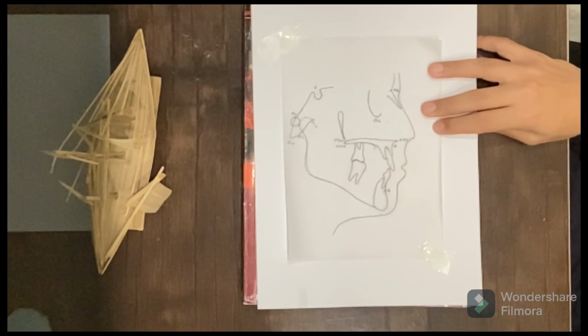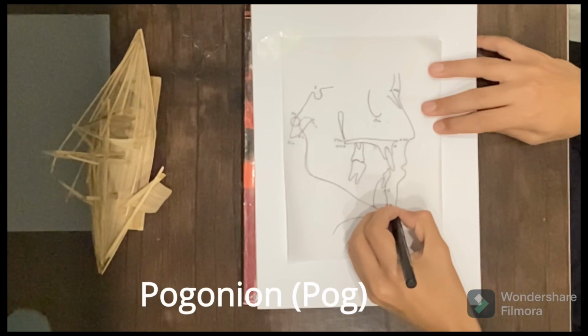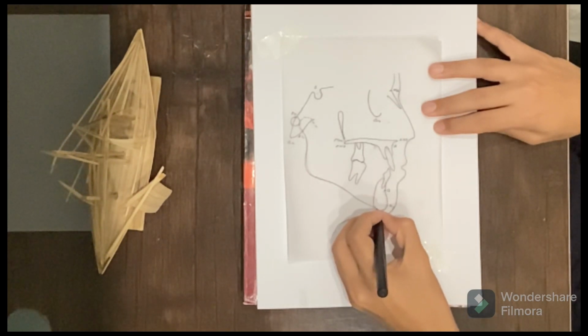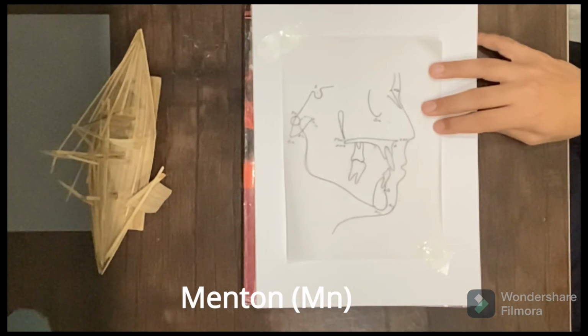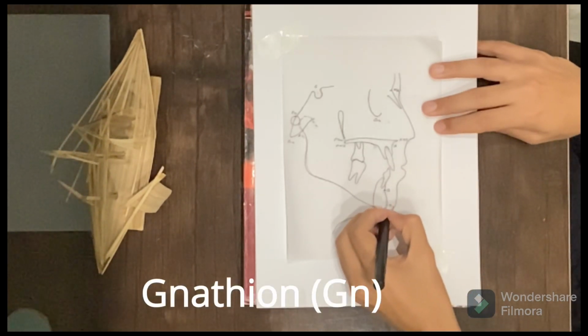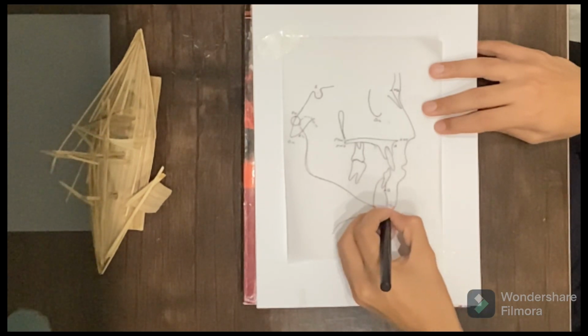Now the other one is the Pogonion. P-O-G, Pog. Pogonion is the anterior-most prominent point on the outer contour of the bony chin. And then there is menton. Menton is basically present at the most inferior part of the mandible, while the gnathion is the anterior and inferior point on the outer contour of the bony chin. So it is the outer contour as well as the inferior point. It is in between the menton and Pogonion, which is gnathion.